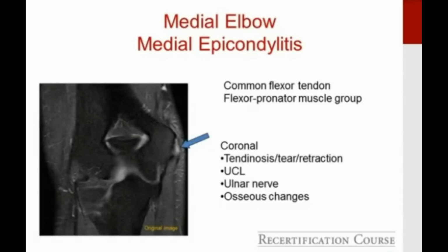Okay, medial epicondylitis is common flexor tendinosis and or tear. If you look on the lateral side, you can see the normal common extensor tendon, which is a low signal band-like structure arising from the lateral epicondyle.